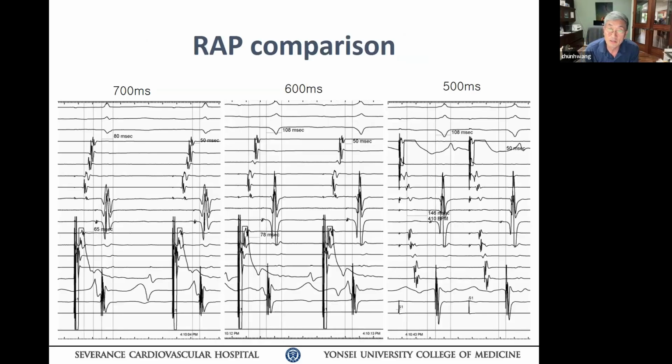AH is longer, but His activation is the same, and your QRS is wider. That's your argument, right? You think this is where the pre-excitation is. If this is pre-excitation, like Washim said, it's got to be fascicular ventricular, below the His bundle, because His activation is the same. How can you have a node ventricular pathway when your His bundle EGM doesn't change?